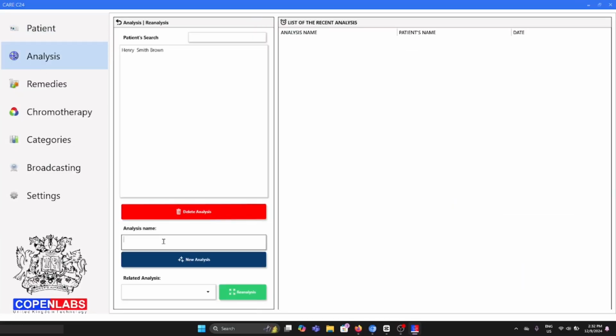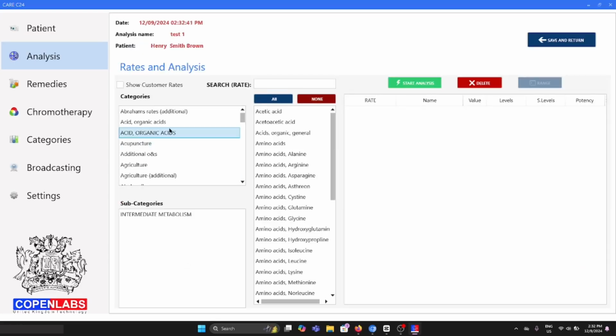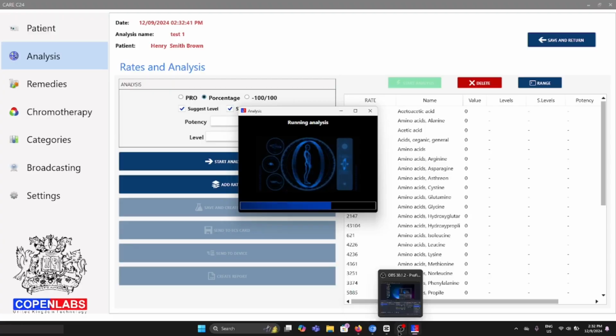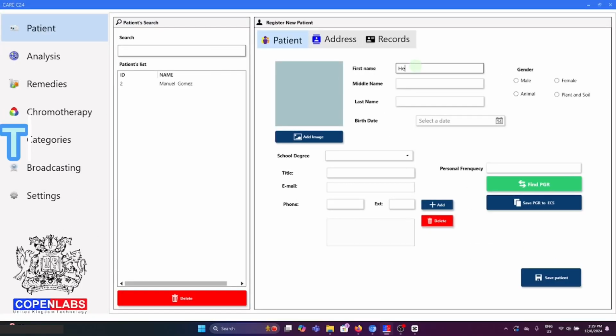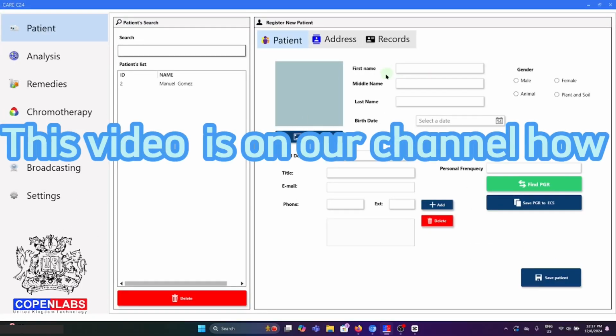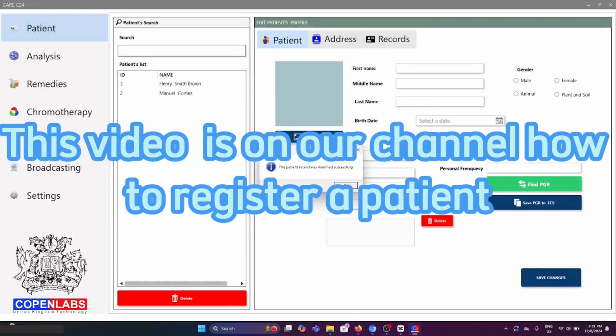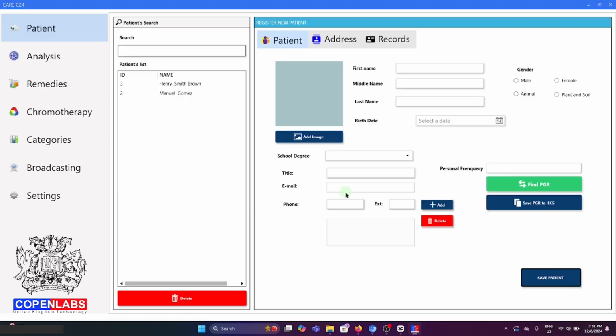In this video, we'll guide you through how to create, view, delete, and reanalyze analyses for a patient. To get started with an analysis, first you must have registered a patient. If you don't know how to do it, you can watch our video on this channel about how to register a patient.